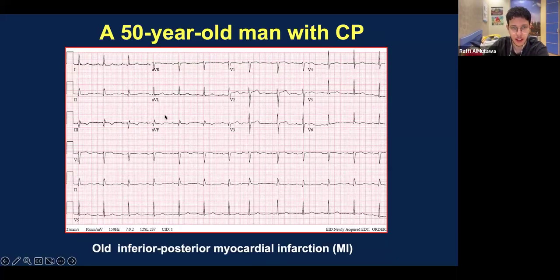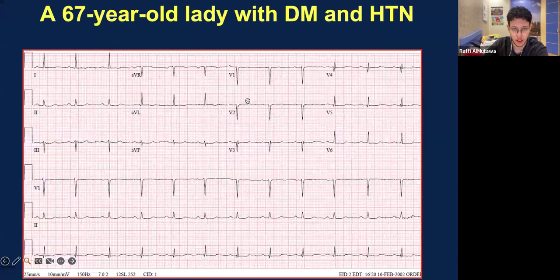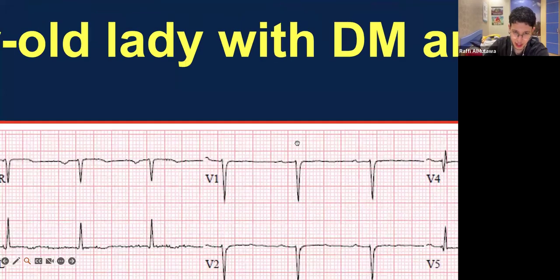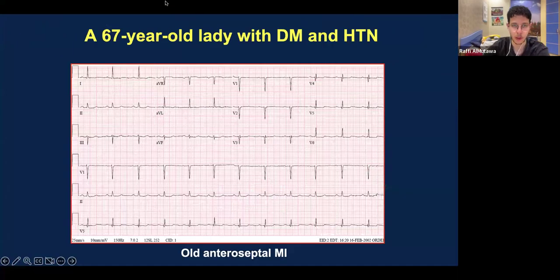Where is RS? So this is the Q. This has to be the R, and the S is kind of buried. The S and T are buried. Again, kind of obscure, but this is what happens with the ECG in this MI. And this is probably a big MI.